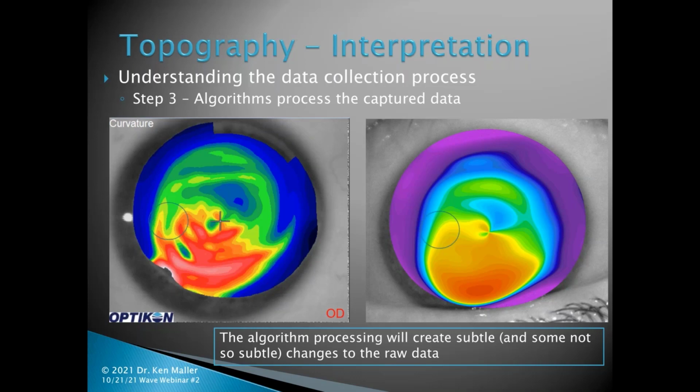So let's take a look for a moment here. I've just compared the left and the right by circling the two areas there. And you'll notice that the curvatures look considerably different on the left and the right. We have that little flattened, sort of triangular shaped, downward pointing area in that circle on the Scout measurement, yet on the Pentacam that doesn't seem to be there at all. Up on the top over here, you can see going from top to bottom on the Scout, it's steep, flat, and steep, yet on the Pentacam image, we can see that it's really just flat and steep.